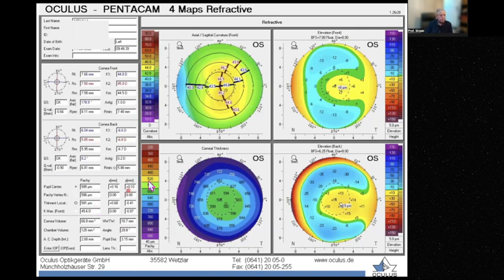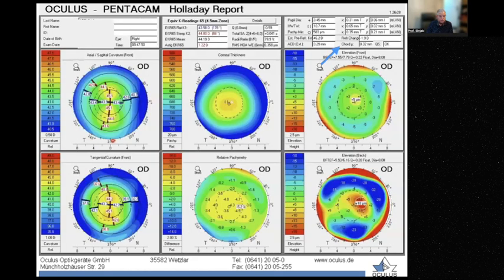But if we go for that, then there is a monster hiding on the posterior surface. Okay? This monster is bulging on the posterior surface, waiting for somebody to come and cut the shield of the anterior stroma of the cornea in order to bulge out.